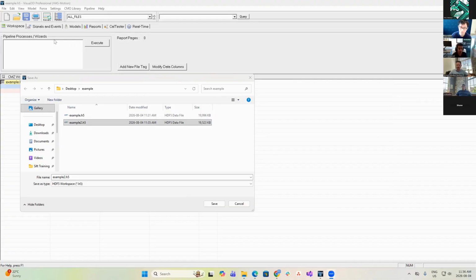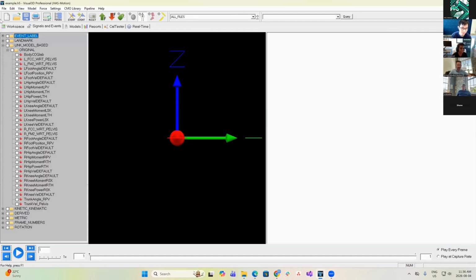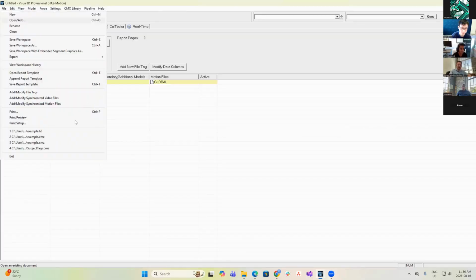Yeah, I guess two things, Amr. Can we show just the signals and events tab here, to walk through how transparent this is to the user, whether we've loaded a CMZ or an HDF5 file? And maybe, if you have HDFView on the computer. Yeah, one second.